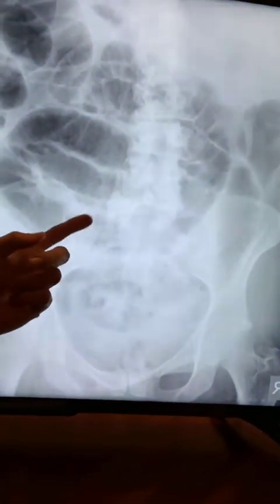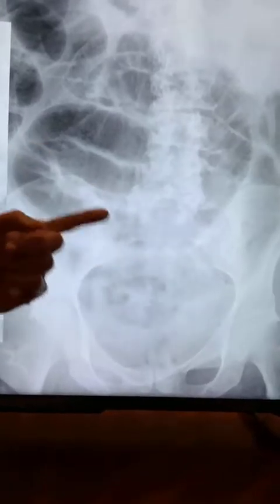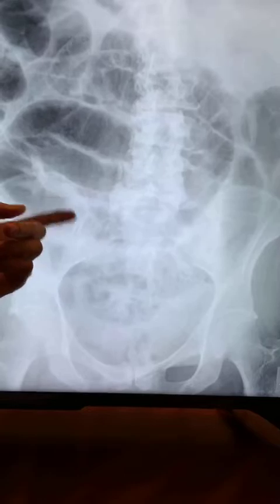So the first thing that I put up was this one right here. You guys all remember this. What is the one thing that's sticking out to everybody's eyes? It's the small bowel, right? Wait a second, how do I know that this is small bowel? Because I actually asked that question too. I think it was split down the middle. Maybe small bowel was a little bit more than large bowel. But there's a lot of confusion as to what is small bowel and what is large bowel.